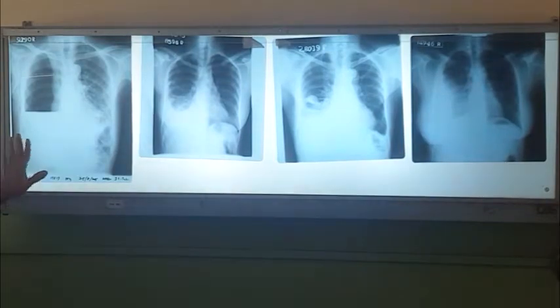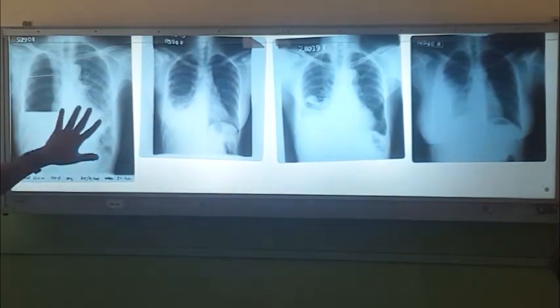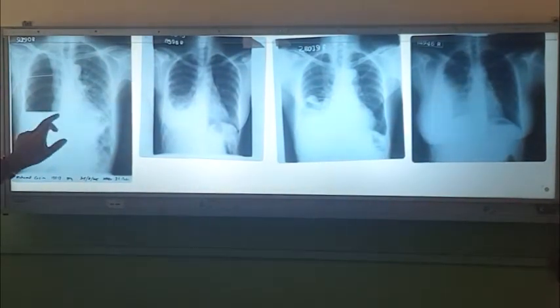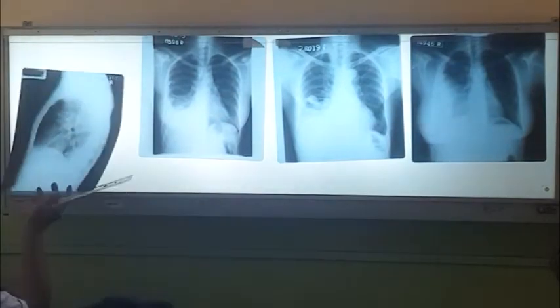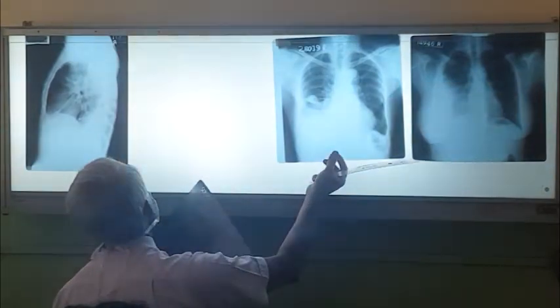So this patient is a TB patient. He has on the left side a lot of cystic changes, inflammatory shadows, acute TB changes, with right-sided hydropneumothorax. This is the collapsed lung. In addition to that, this is an IC tube. You can see a small line of air outside the chest wall, so that is surgical emphysema, right? Okay. This is a poor quality X-ray. I don't have the film you have, but I am keeping this, as a lot of signs are there, right?